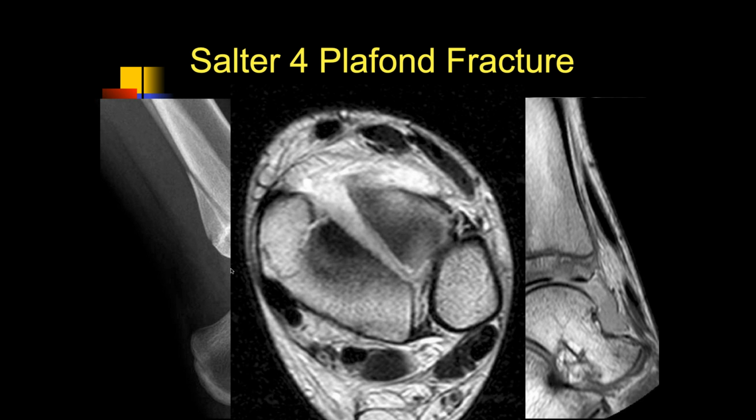So what would you do with this? Send the patient to you. Yeah, I would call it, and 4s you have to fix.